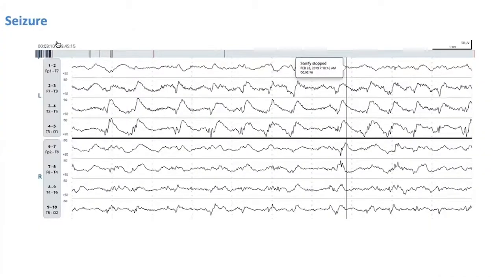We see here part of a seizure. And I think a tricky part of identifying seizures is trying to identify them over a short time window. I mean, it's almost behavioral. If you saw a person having a seizure, but you only saw 5 seconds of the behavior, it might be hard to say whether it's a seizure or not. And the same thing is true for EEG. So looking at 10 seconds, 30 seconds increases the accuracy.